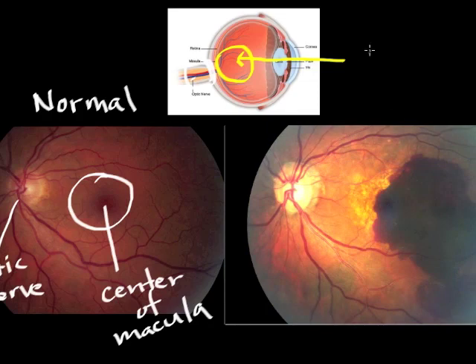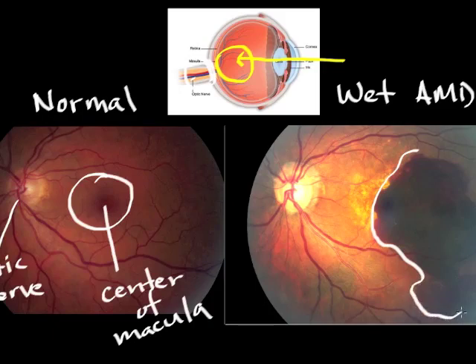Okay, so as promised, here we have a photograph of a patient with wet AMD. And again, unfortunately, here you see the center of the macula, a large hemorrhage. In fact, this hemorrhage even goes outside the macula. And I'll just trace this hemorrhage here with my pen. So here we have a large clot of blood, and unfortunately, this X is where this patient's central vision is located. As you can see, this hemorrhage involves the patient's central retina and involves the patient's central vision. So this patient with wet AMD is going to have a large blind spot in the center of the vision, and again adjacent to the center of the vision, due to this blood clot. And this blood clot comes from blood vessels growing underneath the retina like weeds growing in your grass.